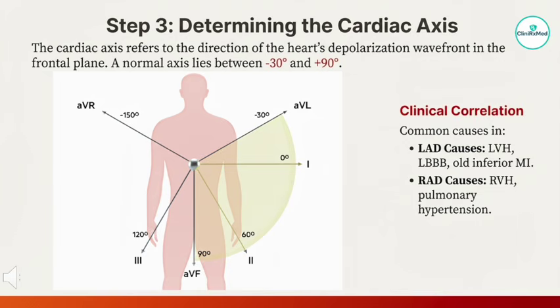While it can be associated with left ventricular hypertrophy, LVH, due to hypertension, an LAD is more commonly a sign of a wiring issue in the left ventricle's anterior conduction branch. Right axis deviation, RAD, is a classic hallmark of right ventricular hypertrophy, RVH.